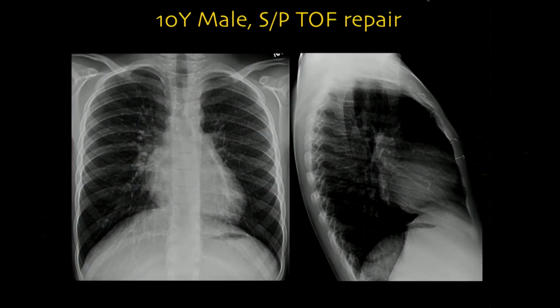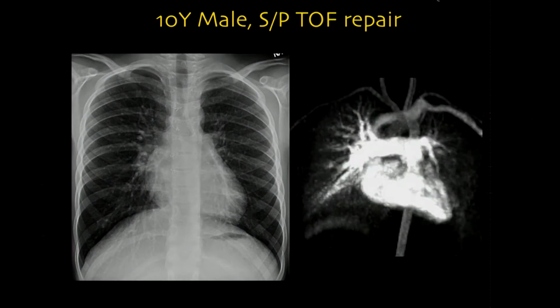And then this is mostly the shadow made by the right pulmonary artery. This is mainly from the left pulmonary artery. If I read this one, I will clearly say there is asymmetric vascularity with significantly reduced vascularity in the left lung. Okay. So this is our CT scan.